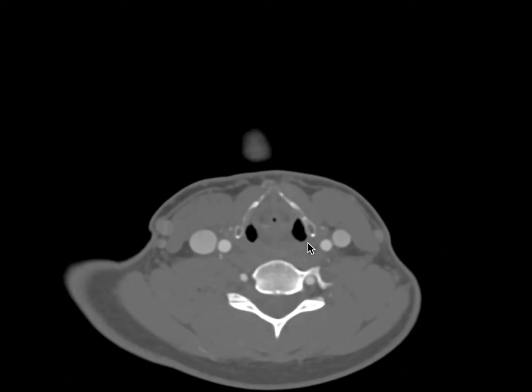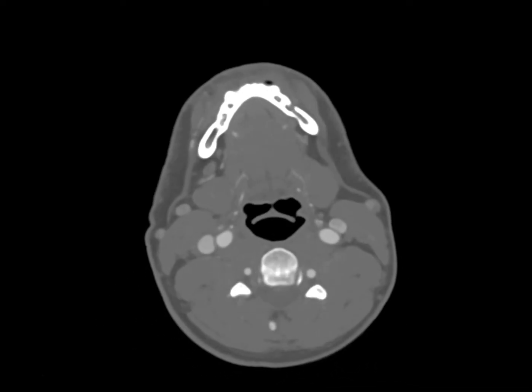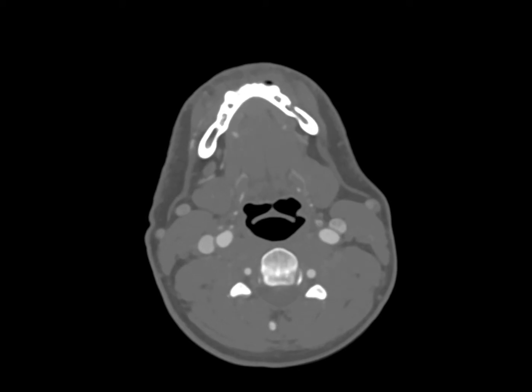It is generally at the upper margin of the thyroid cartilage, or at the C3 to C5 cervical levels, that the common carotid arteries will divide. So going a little further up here, we're going to see our external carotid arteries come off anteriorly. The external carotid arteries will have multiple branches, the first of which will come off anteriorly and will be the superior thyroid arteries.